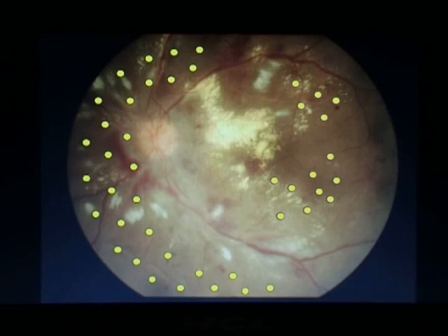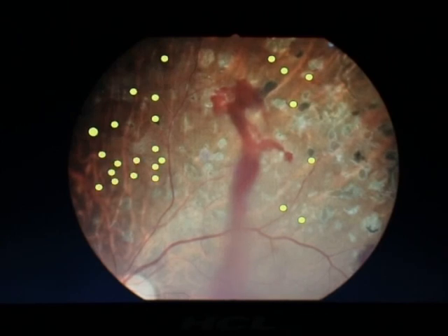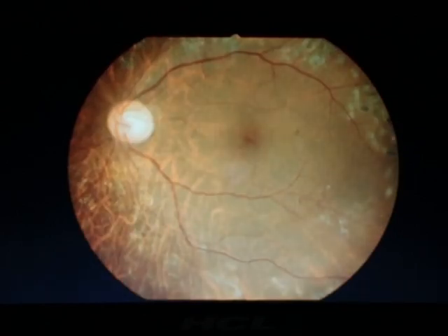In patients with coexisting PDR and CSME, the nasal and inferior quadrants of the retina are first treated along with the macula, and PRP carried out over the other retinal areas in a phased manner to avoid PRP-induced worsening of pre-existent macular edema. In patients with recurrent bleed after a PRP, a pattern tightening laser augmentation or laser fill-in will help stabilize the retinopathy.